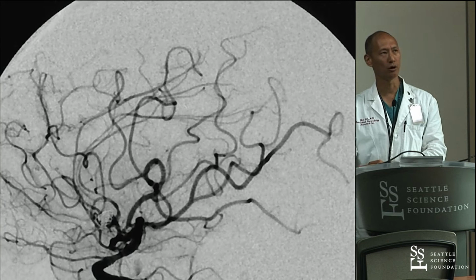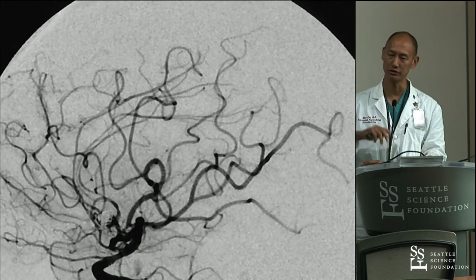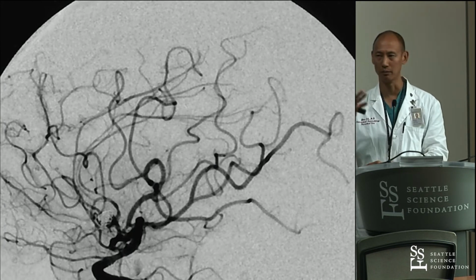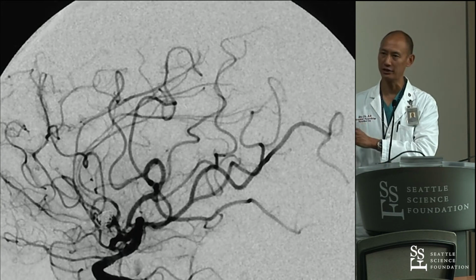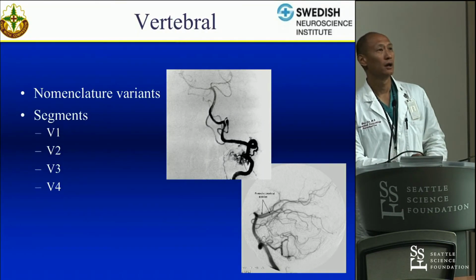The precentral artery supplies some supplementary motor area, and then there's also a lateral candelabra akin to the medial candelabra I told you about from the ACA. That lateral candelabra is also referred to as the opercular branches, and those usually are anterior, middle, and posterior.